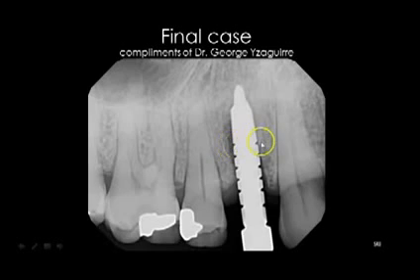Here you can clearly see the marking drill and the depth gauges, or sorry, the final marking drill serves as your depth gauge, because these indentations here are 7, 8.5, 10, 11.5, 13, and 15. So not only do the drills cut phenomenally well, but your marking drills also serve as a depth gauge.